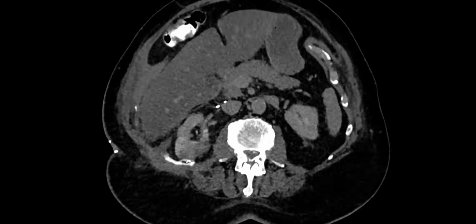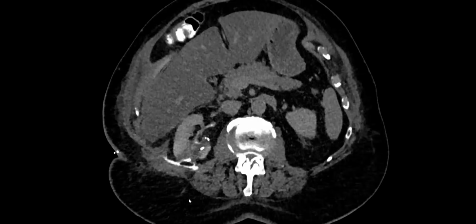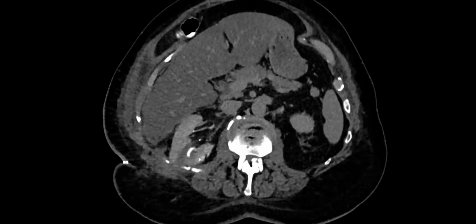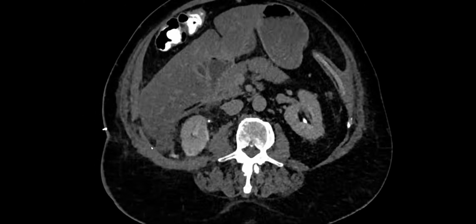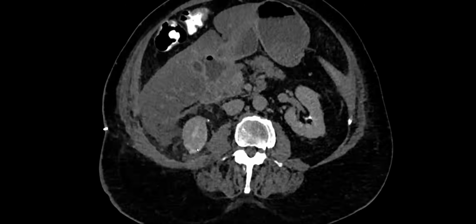I don't know, it's just a cute little example. They put a stent in, a nephroureteral stent, to pull the urine down the path of least resistance, and they're going to see if this dries up on its own. Anyway, this is one of the hazards of doing a partial nephrectomy so close to the collecting system, to the calyx. They try to oversew the calyx, but it often is a very delicate structure and that doesn't always work. So testing the creatinine from the fluid is helpful, and then doing this delayed scan.